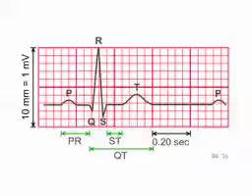The ECG waveforms come in waves, segments, and intervals, and they all represent a specific component of the electrical activity of the heart. The P wave represents atrial depolarization. The QRS represents ventricular depolarization, whereas the T wave represents ventricular repolarization before the next P wave appears again.